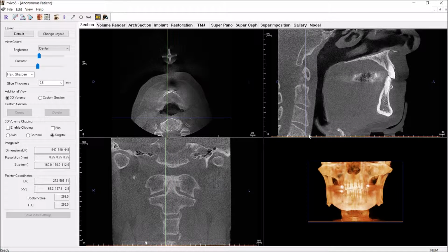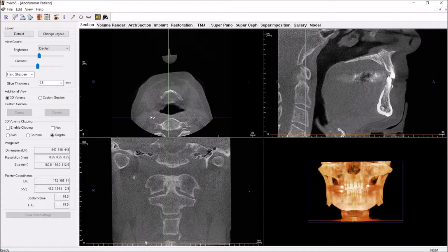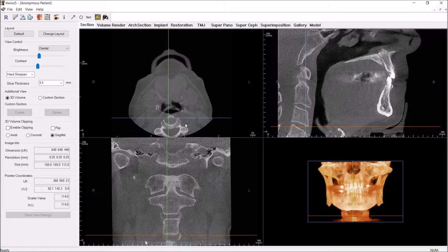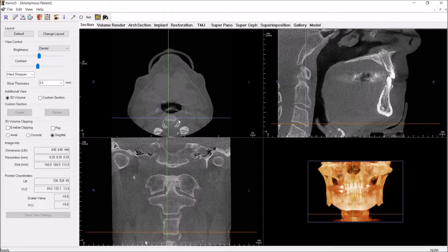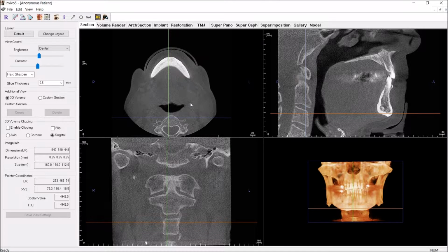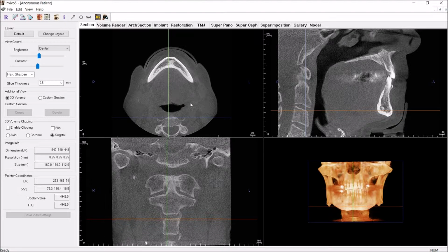And so one last time through this, as we look at the inferior part of the axial view. So here we're looking at the cervical spine. You see the vertebral artery foramen. Looking at soft tissues, looking at hard tissues, everything here in the inferior portion. Comparing both sides as you kind of slowly scroll up frame by frame.